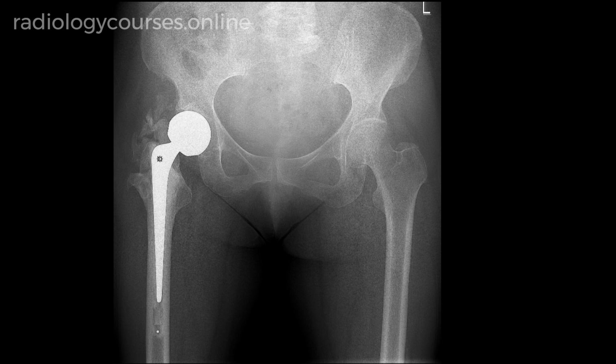The treatment of this heterotopic bone formation is usually conservative, treated with anti-inflammatories or painkillers, and reassuring the patient that there is nothing major going on at the site of the hip replacement apart from this new bone formation around where the surgery was done, which is quite common in people with THR. This is not uncommon or rare, and this is not considered a complication of a THR or hemi replacement.